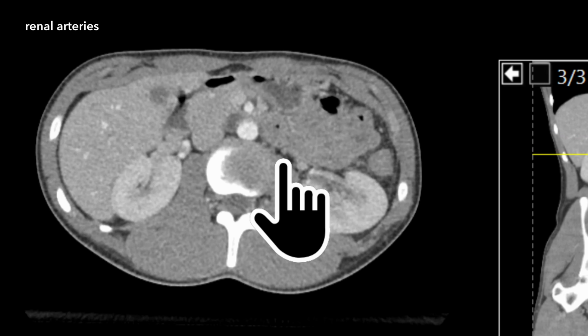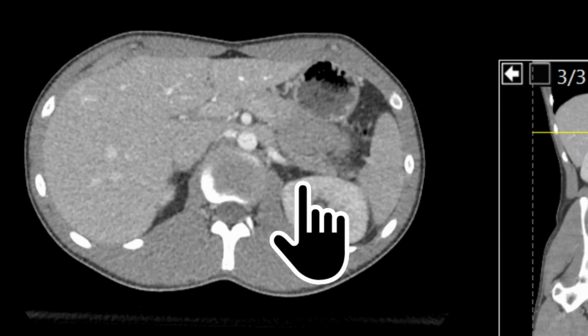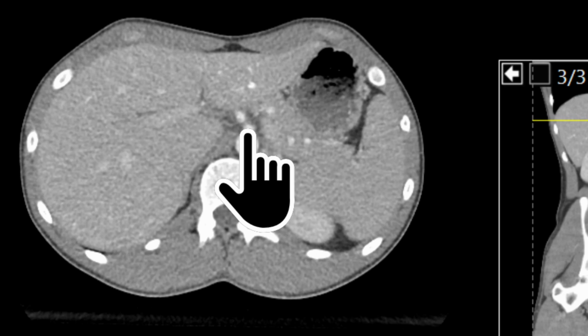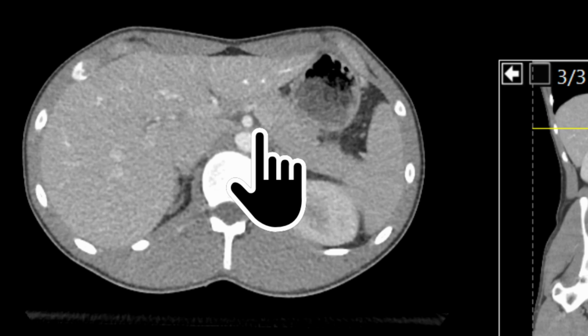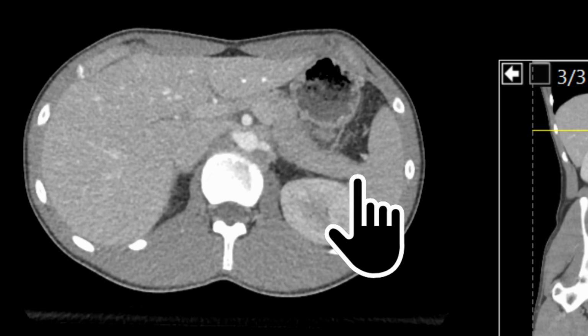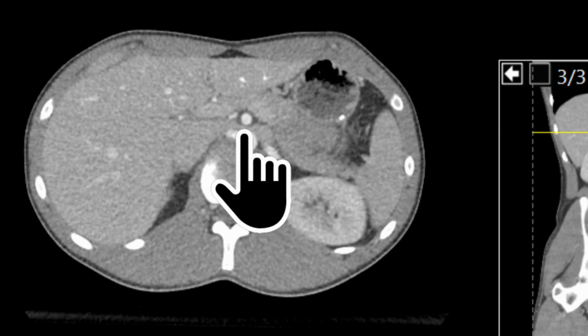And the renal arteries are posterior to the renal veins. So this thing I see here, so we have the aorta, scrolling down, there's the superior mesenteric artery, scrolling down, we see this blood vessel going whoosh, and look, it's going from the right side across to the left, and it's a little less distinct, isn't it, than these blood vessels, but this is the left renal vein.